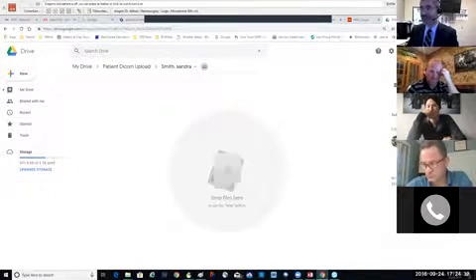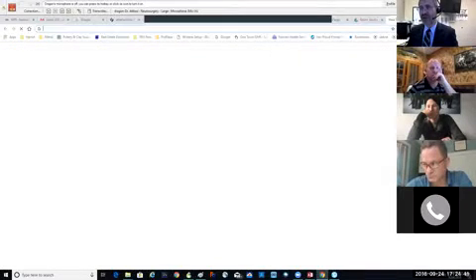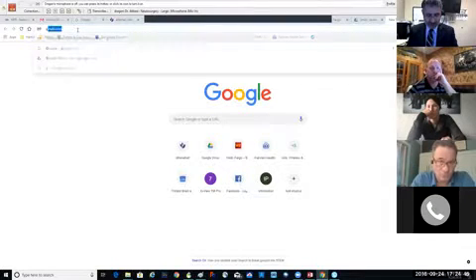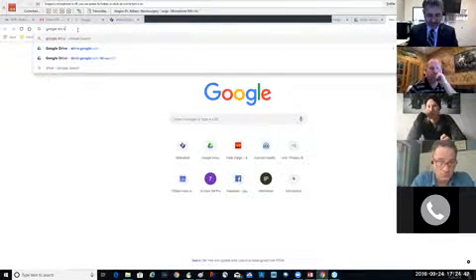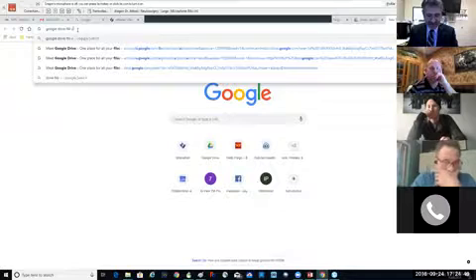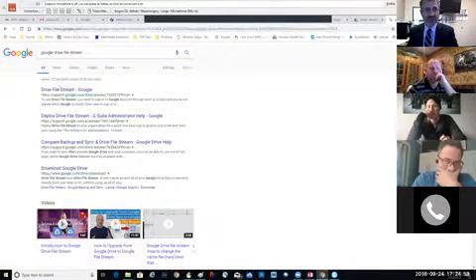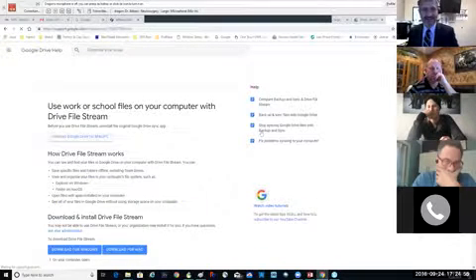Or what I can do as well is another step that everybody should do because that makes your life so much easier. Go to Google and look for Google Drive File Stream. It asks you to install Google Drive File Stream, and here, download for Windows.